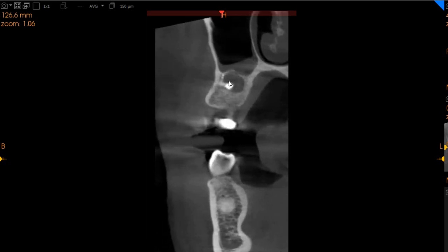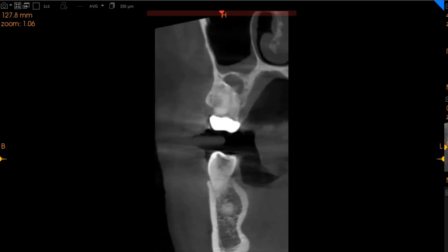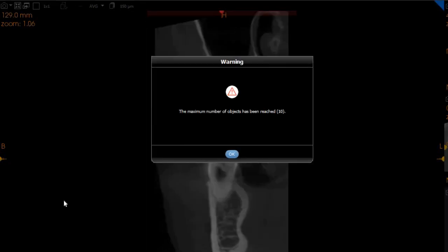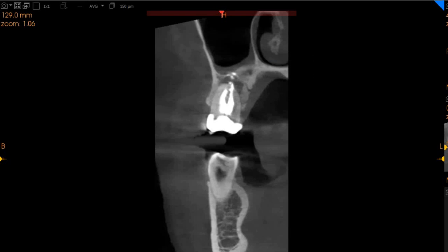here we've got a root canal filling material extending from the 5 into the periapical tissues as well. And you can see that the obturation has been done, and the obturation material also here is, you can see very clearly, part of the radiolucency, part of the floor of the sinus. We've got a short GP in the buccal, and we've got an overextended GP in the palatal, as you can see on this transaxial view.